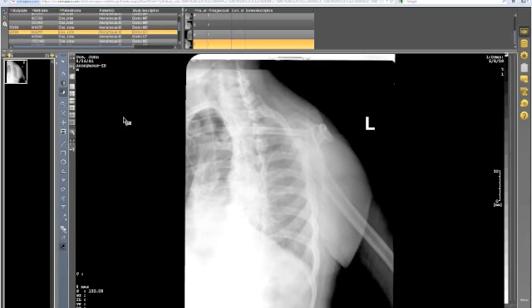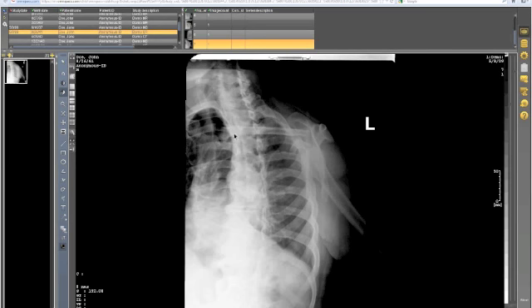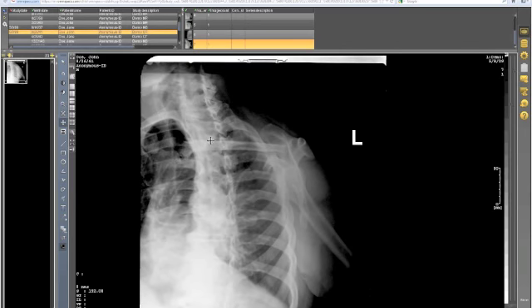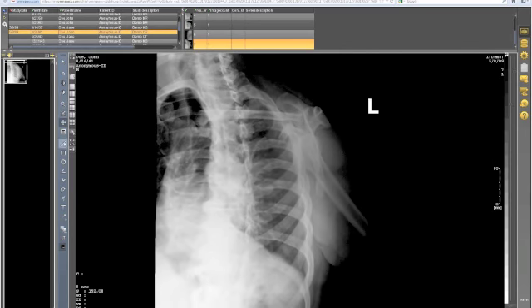Over here, just below that icon, we have the window level based on whatever region you've selected. So it's only going to look in there and auto window level the entire image based on the details within that area that you selected. Over here on the left, we have the magnifier. So it will magnify a small portion of the image that you're viewing. Here we have the zoom. And again, it's a click and drag back and forth. And then pan to adjust the region and so on.